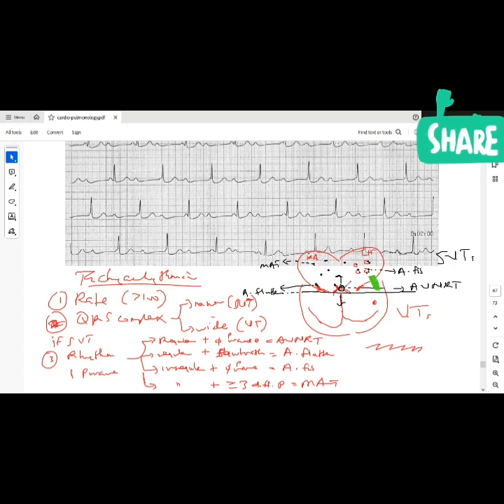These people, if they don't have an SVT, you won't know that anything is wrong with them. They're healthy otherwise. So if they have an SVT that will cause a ventricular rate of 200 in a healthy person, it will cause a ventricular rate of 4, 5, 600 in that person, and they can die suddenly from that. And this is what we call Wolff-Parkinson-White syndrome.